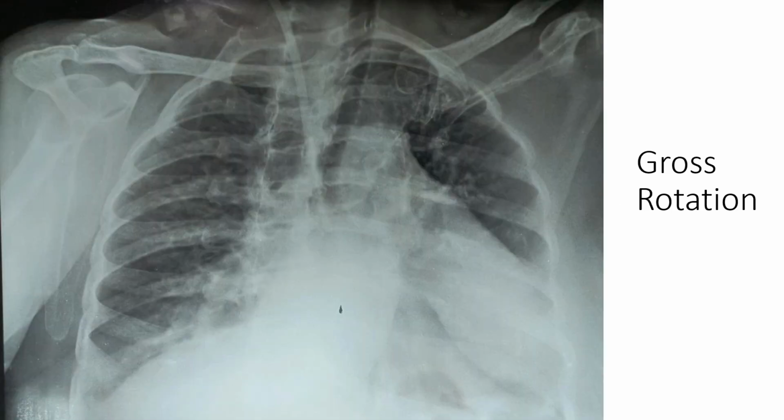Again, we are seeing another x-ray with similar presentation where this is the clavicle and this is the medial end of the clavicle up here, and this is the left clavicle, medial end of the left clavicle is here, and the spine is here, and so the spinous process should be somewhere here, right? So again it is grossly rotated, and there's so much coming up, and no reasonable interpretation is possible.